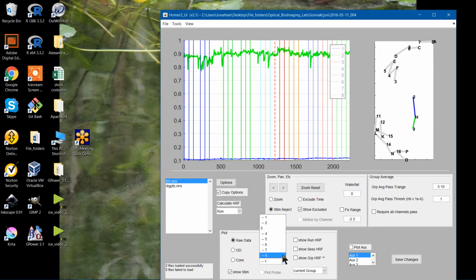And you'll notice down here I have all of my drop-down menus. This 3 here is set in. I wanted to show you this. This is basically, I've done this previously. If you remove all 3 of, in my case, all 3 stimuli of the same stimulus, or all 3 trials of the same stimulus, this will designate that the stimuli is not active. It's no longer being considered. All of these double dash lines say that they are being considered. And we'll actually show this in just a second.